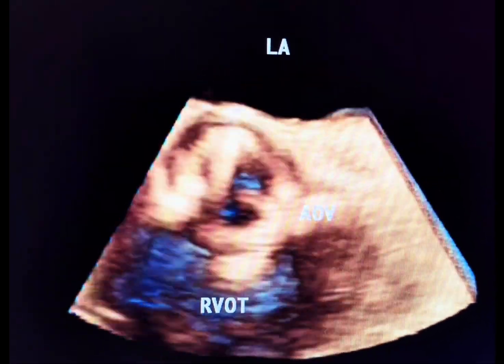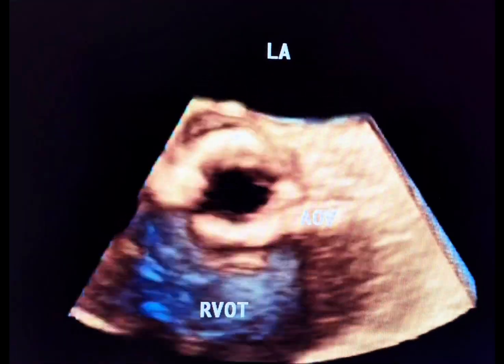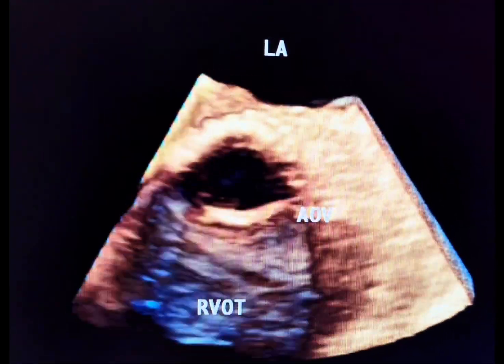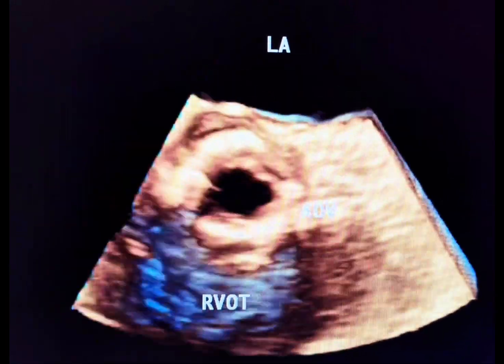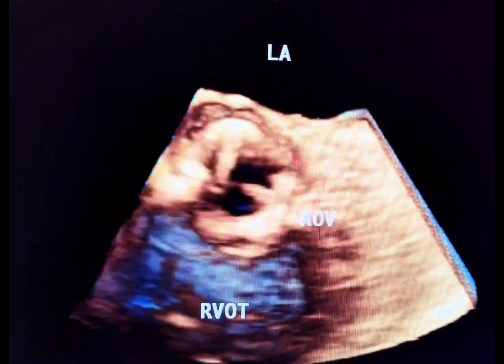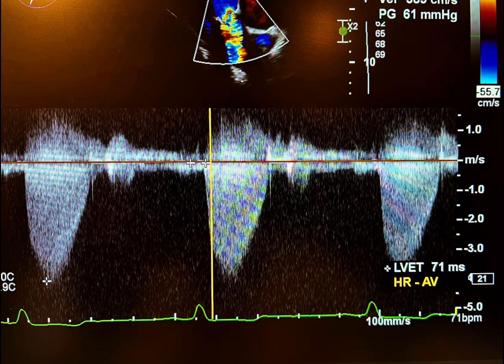Misdiagnosing PPM can lead to prolonged anticoagulation, inappropriate thrombolysis, unnecessary redo surgery, and unnecessary CT or transesophageal echocardiographic examinations. True prosthetic stenosis usually produces a prolonged acceleration time. In contrast, patients with PPM often show relatively normal acceleration time despite elevated gradients, like this image.